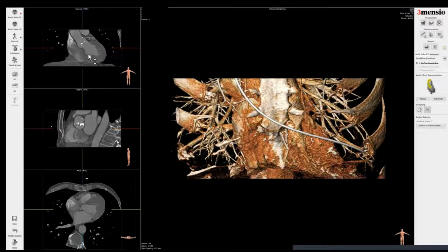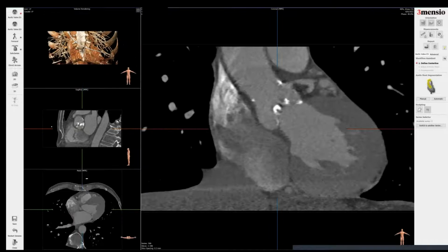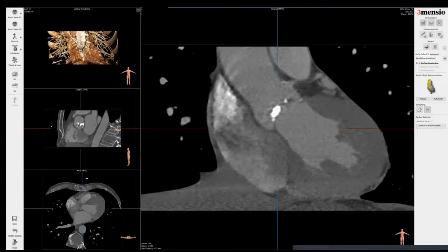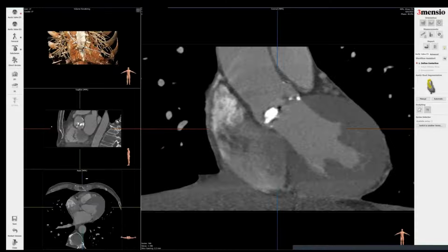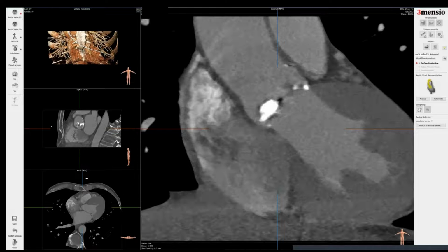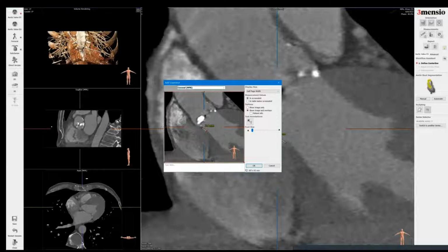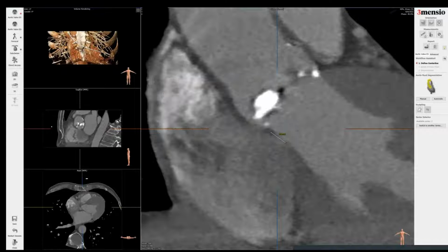So the annulus workflow involves first looking at the septal length. This is only an estimate. So I look at this coronal view, and I'm looking for the base of the non-coronary cusp and where the muscle starts. I zoom in to the field, draw a ruler and highlight this estimate of the septal length, and then I save that screenshot. We have a Dropbox for saving that. And then afterwards, I do the automatic segmentation of the annulus.